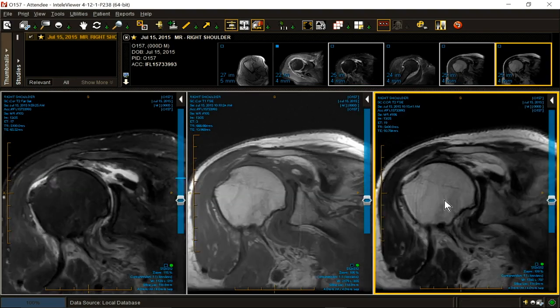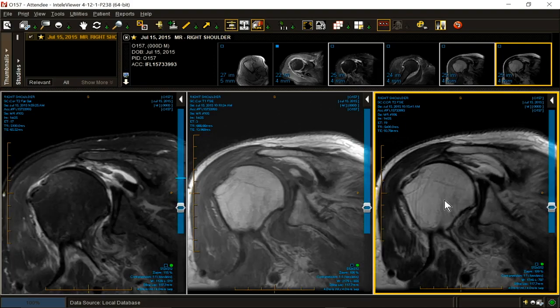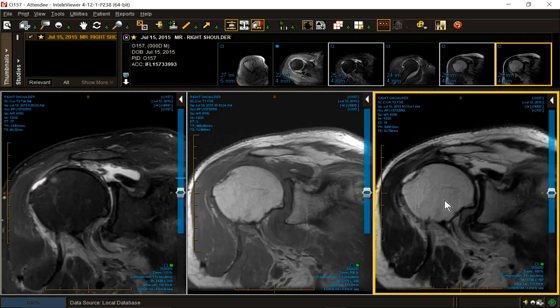There's more new news. I'm going to scroll and ask for your new news assessment. What do you think of her axillary pouch? It's pretty floppy, isn't it?